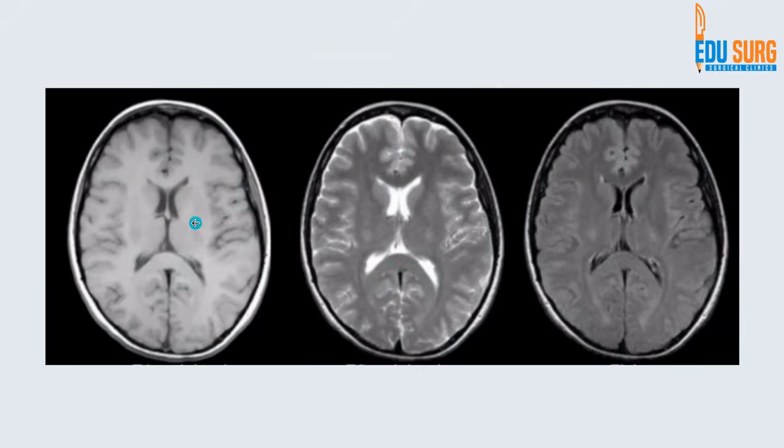Gray matter is looking gray, so that is also something that is good. Now here, if you see, the gray matter is darker, the water is also not white, and still you can see some areas around the ventricles which are showing very good contrast, which you cannot appreciate here or here. So there is something white here, but the gray matter is not as gray and the water is not as white. This is a fluid attenuated sequence of T2.